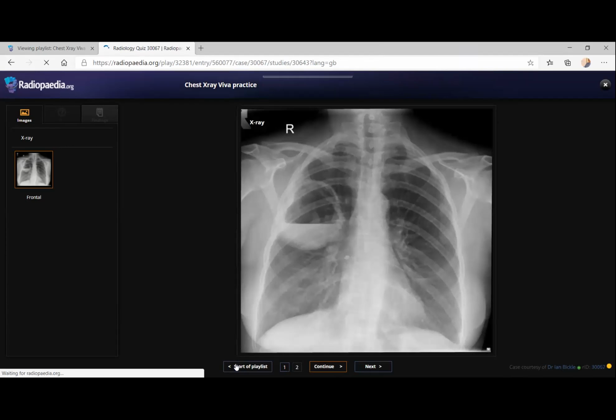Okay. And this one you did well. It's a very thin-walled cavity with a fluid level. You don't ask the examiner whether this patient is having fever or something. You have to tell your DDs as per the clinical scenario. You've got to say, if this patient is acutely unwell, or having fever and signs of raised CRP or WBC count, I'll think of the possibility of lung abscess or infective etiology. Or if this patient is a case of malignancy, you tell that. Don't ask the examiner a direct question like whether this patient is having symptoms or fever. That's not good. Okay?